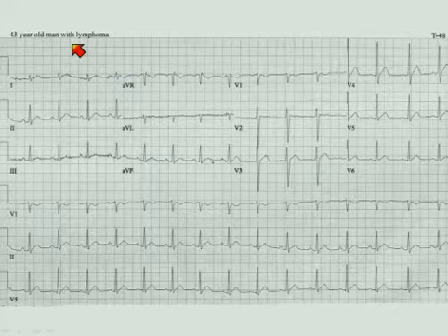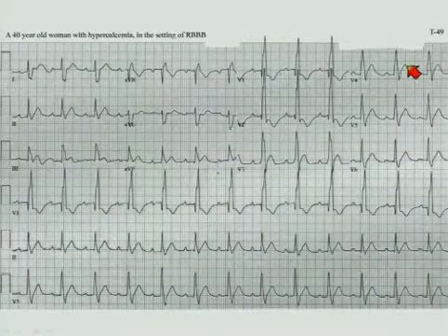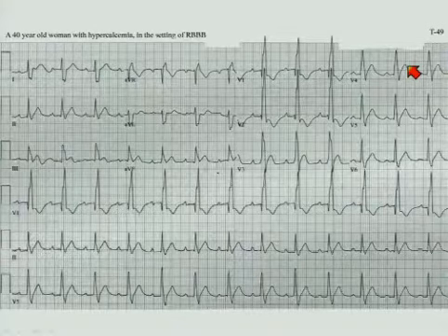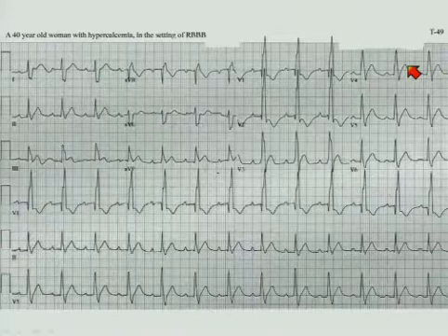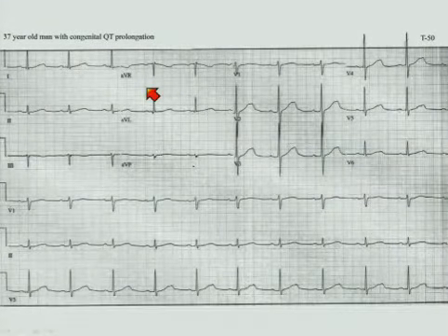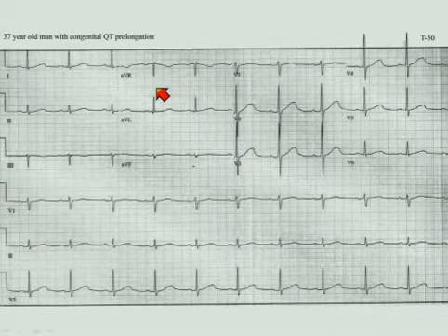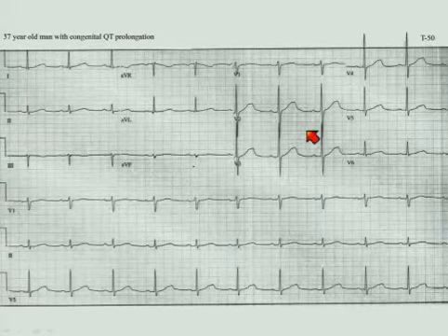So this is hypercalcemia. And here's another one, just to show you how close it can be to the QRS and how it can simulate ST segment elevation. This was just hypercalcemia. Yesterday, I'm sure you saw several examples of congenital QT prolongation. Here's just another one.